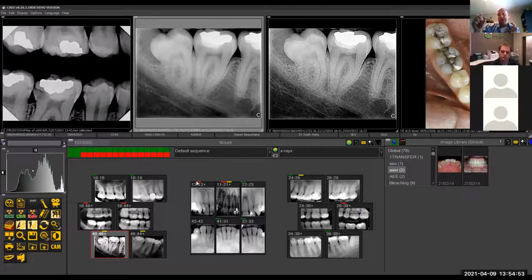We've even tweaked certain ops. You might say on this op I'm going to expose at 0.14, and on this op I have to do it at 0.16 because this X-ray head's not quite the same. So when we apply these filters automatically, you do get a little bit of variety in the images. That's why we still keep it external, so you can just click it if you want to see how it treats the image.